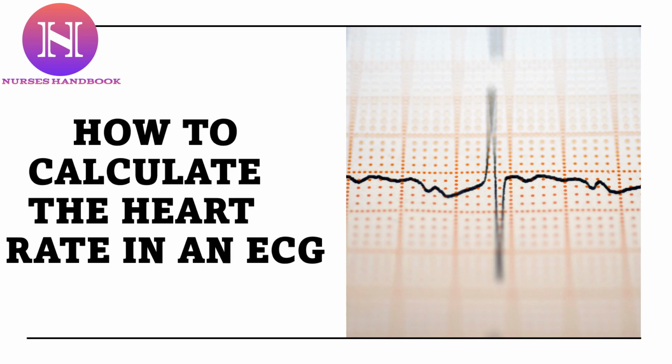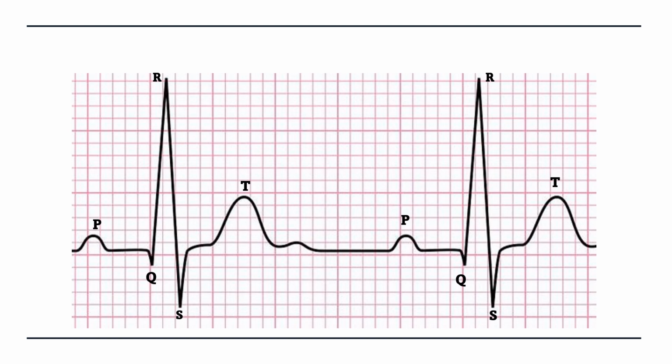Hi guys, welcome to Nurse's Handbook, and today I'm going to share with you about the calculation of the heart rate from an ECG. So before I tell you about the calculation methods of heart rate, let us get a general idea about what the ECG paper is, what is the concept of the big square and the small squares in it.